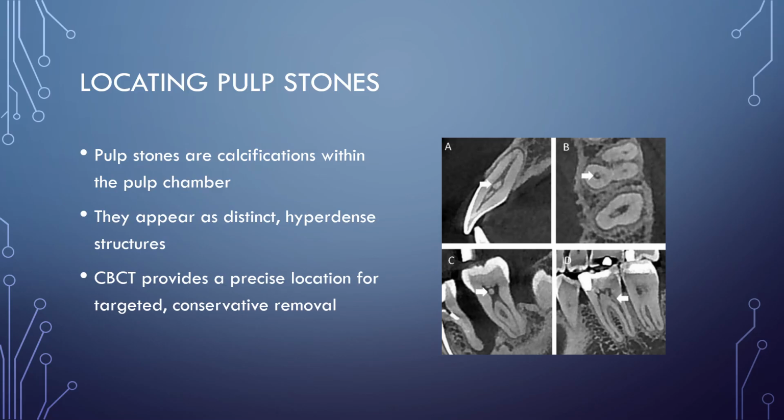When reading the scan, you should measure the exact depth and width of the stone. This information is invaluable, as it allows you to be much more targeted and conservative when attempting to remove or bypass the calcification.